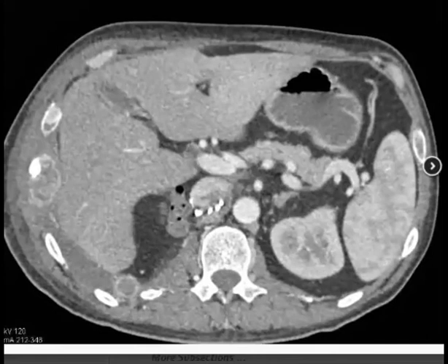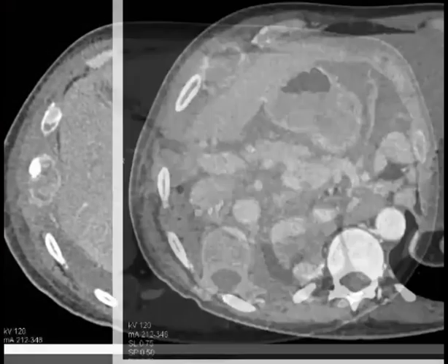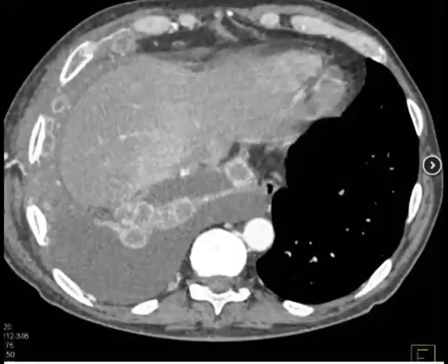If it is not peritoneal and you have this image. Okay, because we have to finish in 10 minutes, I will tell you the answer. If you show us the bone window to see any bone lesion, I wish I could find it, but these are selected images.